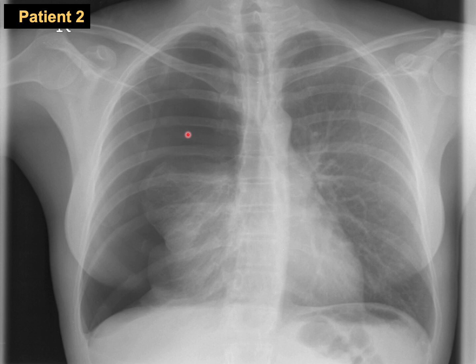So again, whenever you find a finding, continue to complete your approach. So we have finished A, B. I think we need to finish the B, breathing. This is the diaphragm. Okay, and I think you can appreciate that we can see the diaphragm here, and on the right side the diaphragm should be a little bit higher than the left side, but here it's at the same level because the diaphragm is pushed down by the pneumothorax. Okay, there is no external or soft tissue emphysema here. So A, B, C. C for the cardiac shadow, I can appreciate it here, but here it's not very well seen, so mostly it's a little bit pushed to the left side.